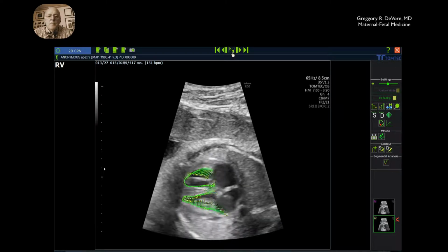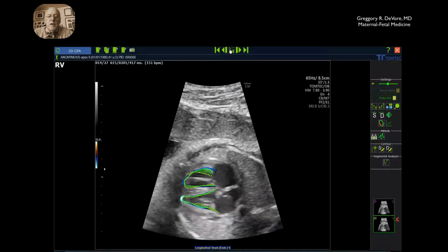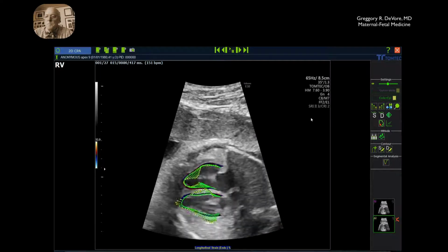Often investigators have suggested that the ventricle has a certain torsion as it moves. You'll see the apex is moving in this direction, the base is in this direction. This is not very quantifiable, but also interesting to view. Here we have then the corresponding clip with the vector and the strain display.